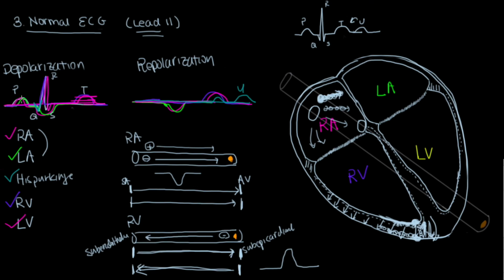such as how we kind of looked at how the P wave can change morphology. If we see bundle branches in terms of how the conduction is delayed for the right ventricle or the left ventricle, you may see this QRS kind of splitting apart and seeing the right ventricular upstroke on its own, or the left side on its own, and you may see kind of like an M shape or something along those lines. If you see the U waves or inverted T waves, that also kind of comes into play when you're thinking about the order in which things repolarize or depolarize down here.